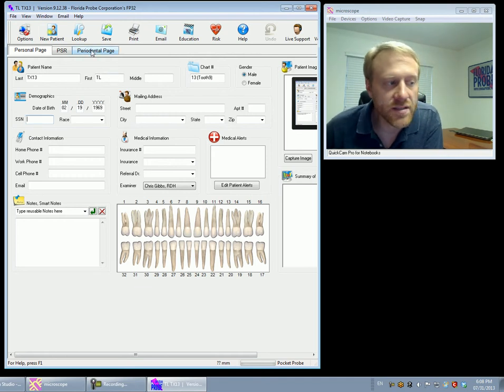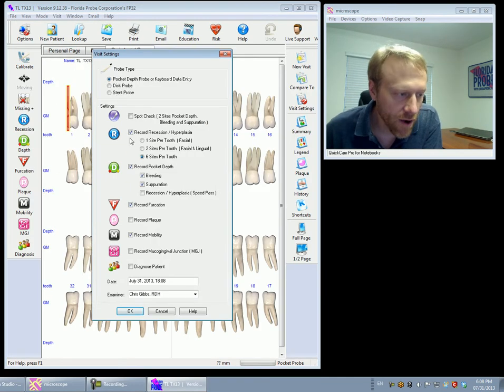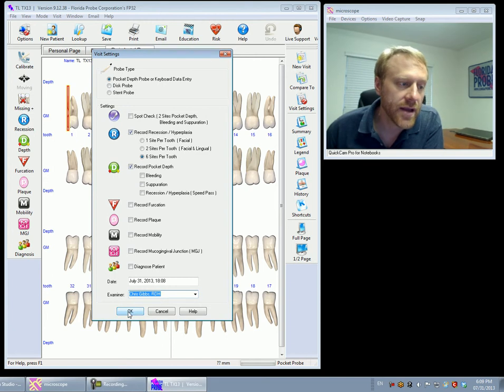Now once I start the exam or get ready to mark the missing teeth, I can just click the periodontal page. It's going to start off with a list of everything that I normally recorded last time. So what I want to do is update this, and I want to make sure that we are going to record recession and hyperplasia at 6 sites per tooth, pocket depth at 6 points per tooth. We're going to do nothing else. I'm going to have all of the other items unchecked. Today's date should be automatically brought in from the computer, and the examiner name, if you haven't already entered your name as an examiner name, should be entered at this time. I'm going to click OK to continue.